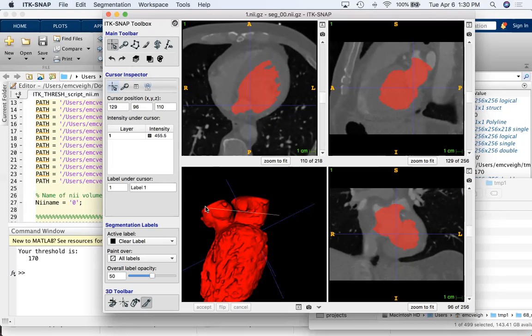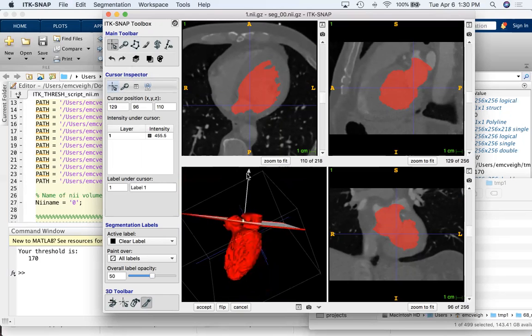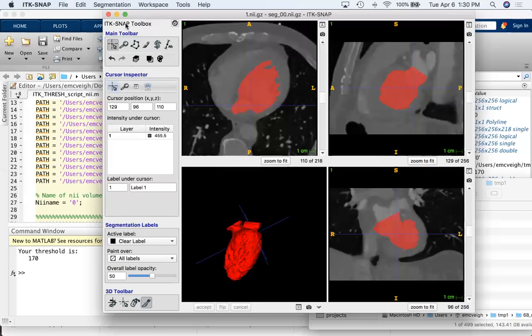Let me see how you did the knife. I think I need to zoom out, there are arrows up here. It's going to cut everything towards the arrow. So now I'm back to these, and I will also cut that off. Click. And now I'll save it.